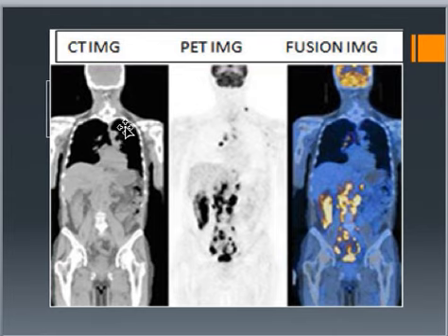So this first image here on your left is a CT scan, and then you've got your PET scan here. So the CT scan shows the anatomy. The PET scan is going to show your hot spots or where there might be abnormalities. And then when you put them together, you've got a wonderful image that can show you not only the hot spots, but exactly where the area is. So that PET scan finds the hot spots that represent abnormal growths, and then a CT scan locates where those spots are in the body. So it really helps to give a better idea of what's going on and where exactly it's going on in the body.